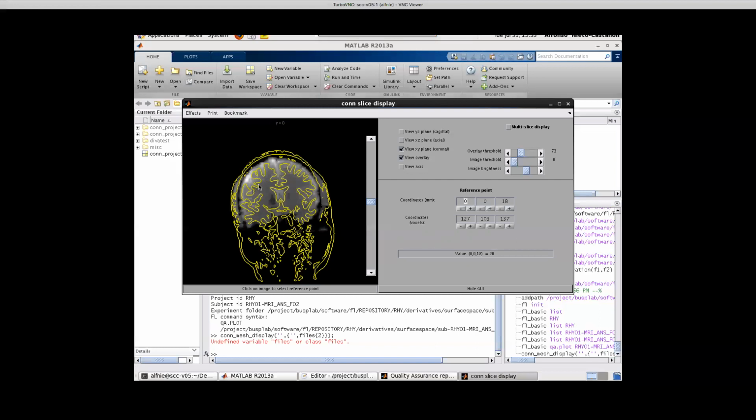I'd really like to see the FreeSurfer white matter and pial surface, if it can do both on the structural or on the functional. Would you prefer the functional? It would be nice to see it on the structural. But again, keep in mind that when we run these subjects through FreeSurfer, someone's going to look at every one of those and make sure that the FreeSurfer output is fine.